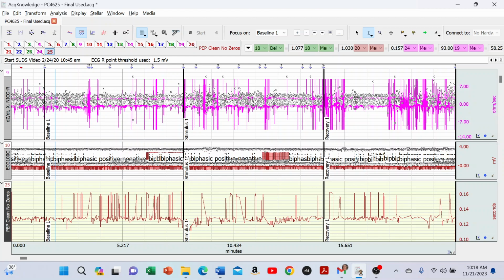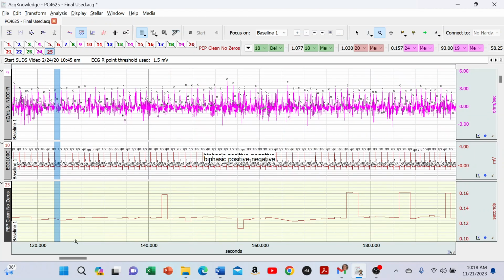With my first pass of cleaning, I was focusing very sharply on, I'm going to zoom into this area right here, the B point. You have to get zoomed in enough that you can really visually eyeball the B point.